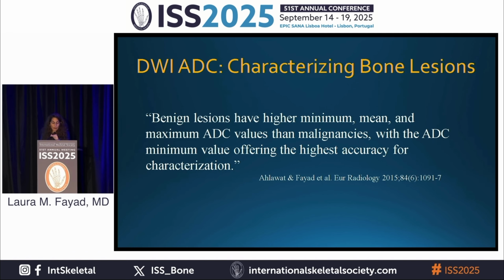We talked about how we use DWI for detection, but of course we have ADCs, our quantitative metrics, so that helps us characterize these bone lesions. And malignancies tend to have lower ADC values than benign lesions, as expected.